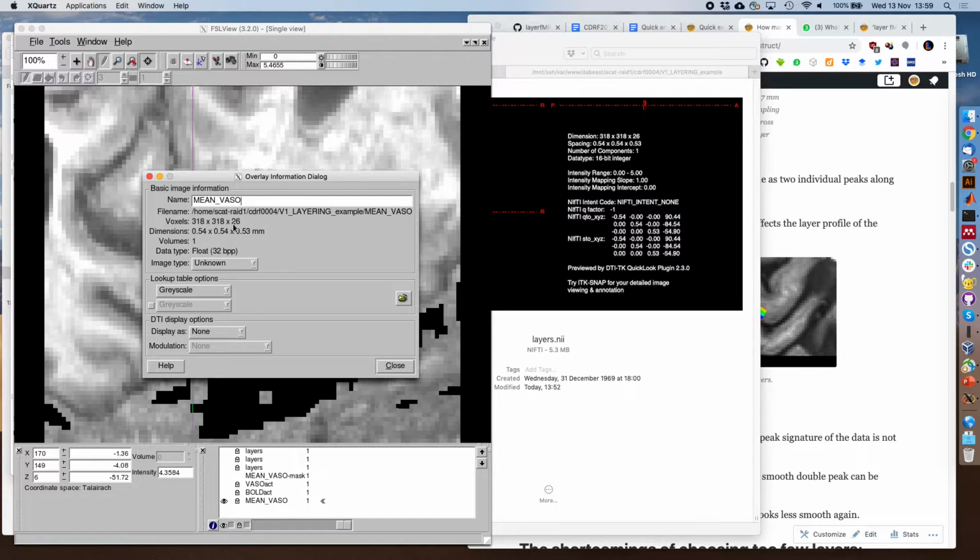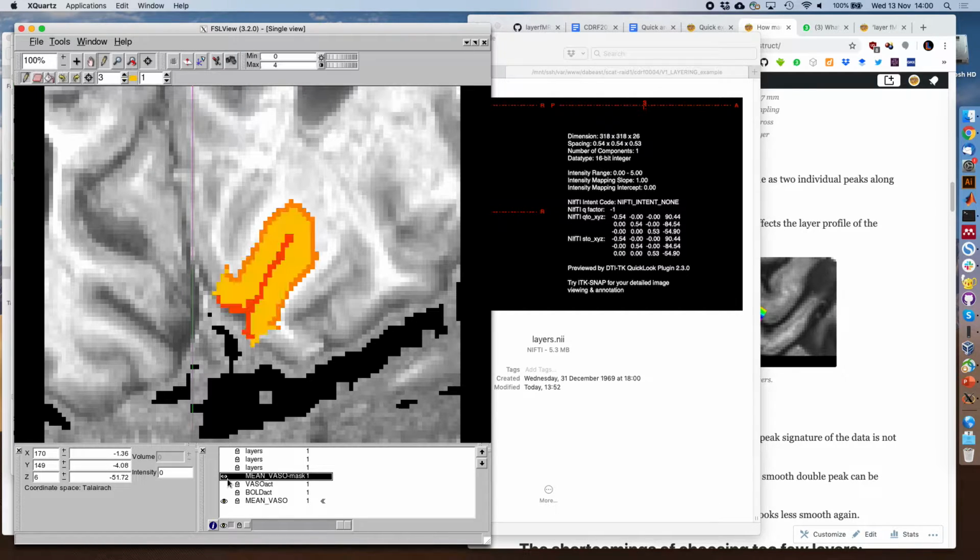I think it's an important point, and I'm not sure if I have an answer. There are multiple dimensions to that question. Maybe one is that the gray matter white matter borderline here is kind of fixed to your voxel grid, which can be a problem if your resolution is too coarse. Then you need to upsample, and we can do that in the next step, which I usually do. It's a kind of additional abstraction level. On the other hand, and maybe your question refers to what I asked Jonathan yesterday, when he has like a 0.75 millimeter anatomical, the accuracy of your gray matter white matter border is in a range of 250 micron, which is kind of hard to comprehend for me.